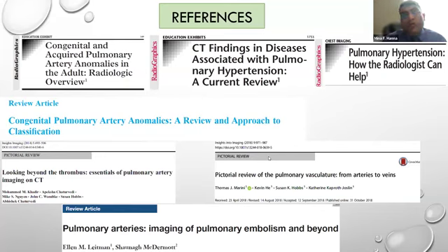The only drawback for the dual energy is that I can't depend on it only. I can't open the dual energy first; I must read the whole study as usual. After that I open the dual energy, look at the maps and see whether these maps will help me to add value or not. Sometimes if the pulmonary embolus is not obstructing, you will find good perfusion. Sometimes there is a small pulmonary embolism and you don't see it on the map because the colors are not well registered over each other.